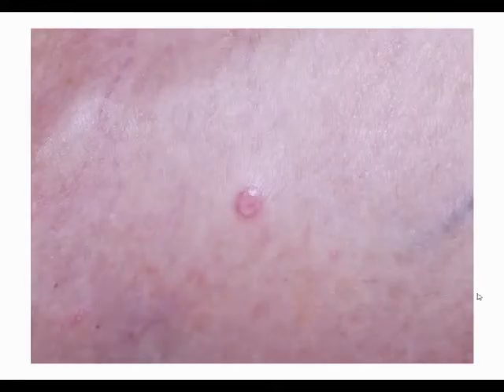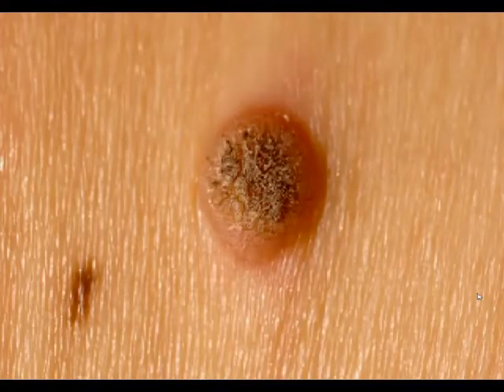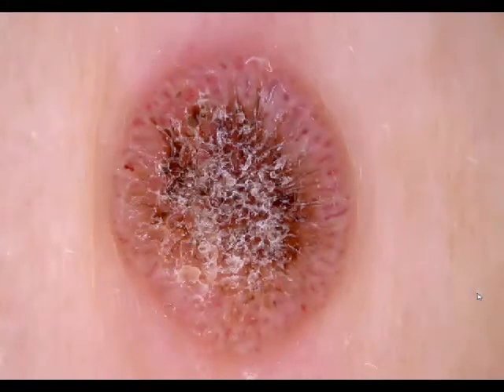Here's an example of a molluscum. Clinically and dermatoscopically, you can see linear vessels. Some of them are straight, some of them are looped. Doesn't matter. Important is that the arrangement is radial, do not cross the center, and the direction is from the periphery towards the center. Here's another example. It's not a molluscum, it's a seborrheic wart, but you can see here looped vessels at the periphery, and the arrangement is radial.